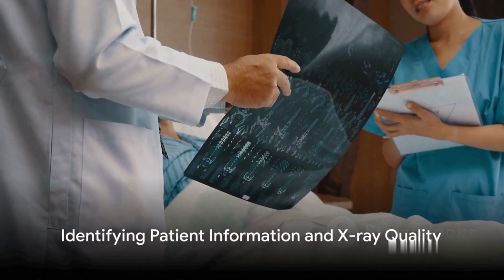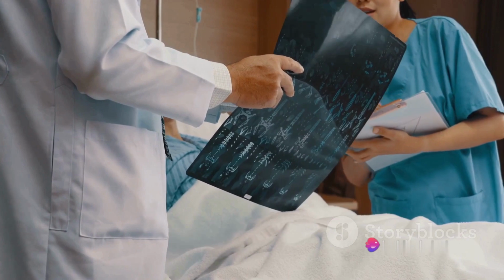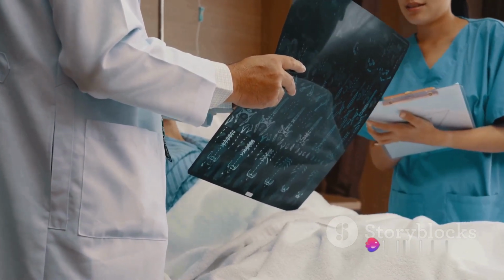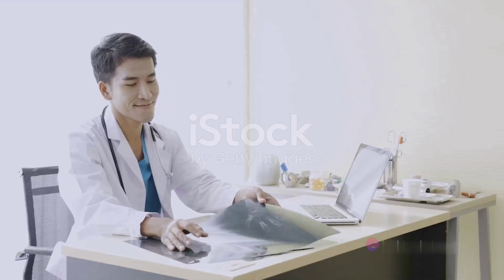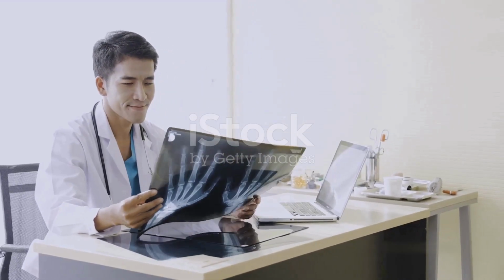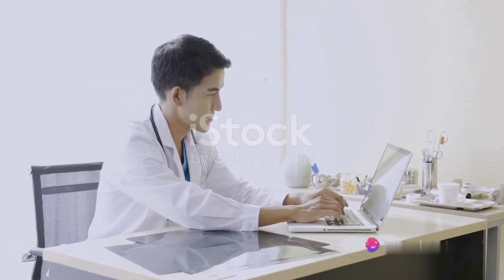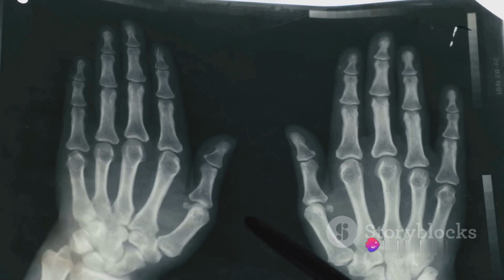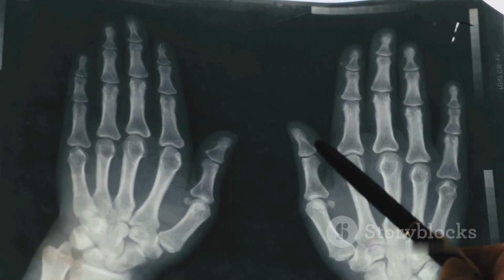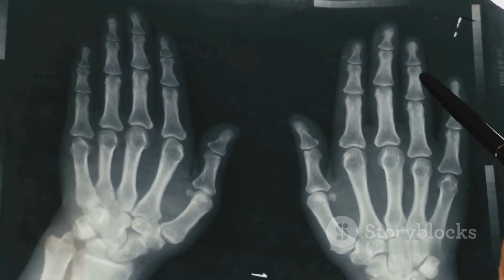Before diving into the X-ray, always confirm the patient's details and the X-ray's quality. This is a crucial step to ensure accuracy and prevent any potential misinterpretations. Begin by confirming the patient's name. This might seem basic, but mistakes can happen, and it's essential to ensure that you're looking at the correct patient's X-ray. Next, check the date the X-ray was taken. This information is vital to track the progression of a condition or to compare with previous images.